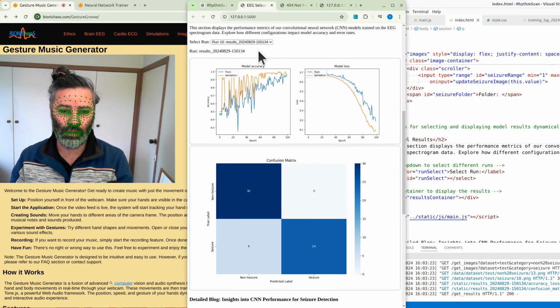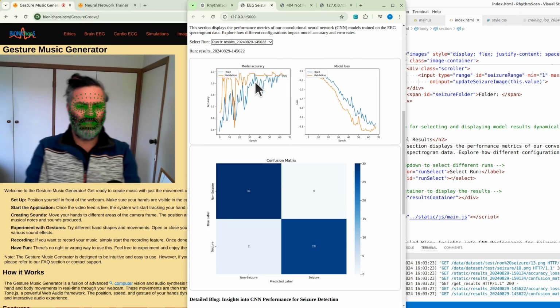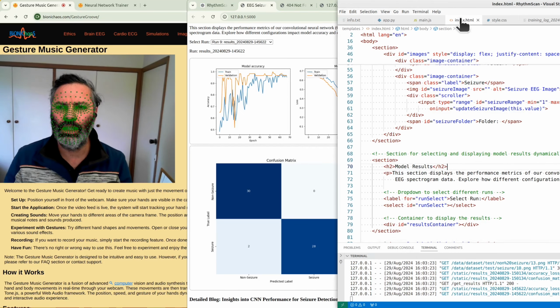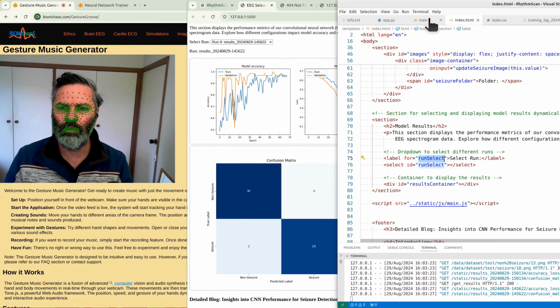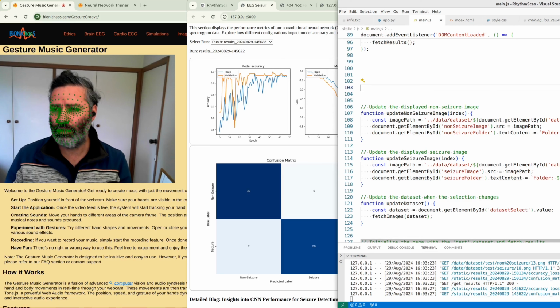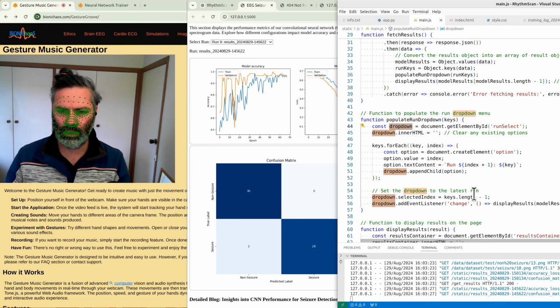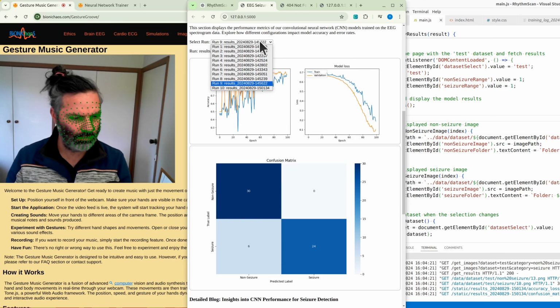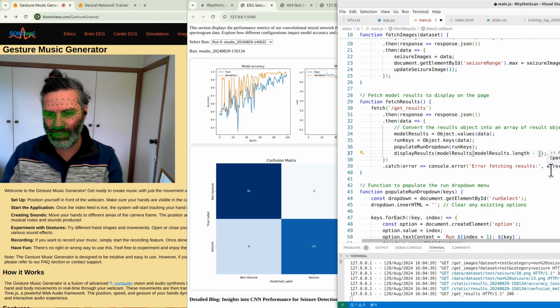Looks good. The one before the last one is yes, we want to select and cherry pick, but display everything else as well. So in HTML, when we have select run, we want the default. What's the ID for it? Run select. We want the default to be drop down. Yeah, -2. -2 will be that one. Actually, we don't want to do it manually in here.